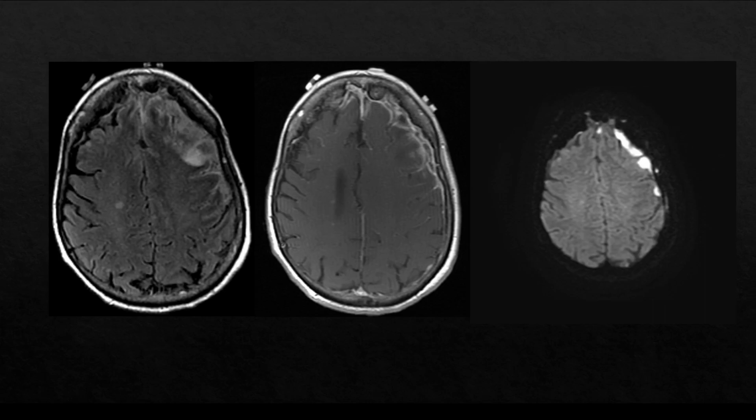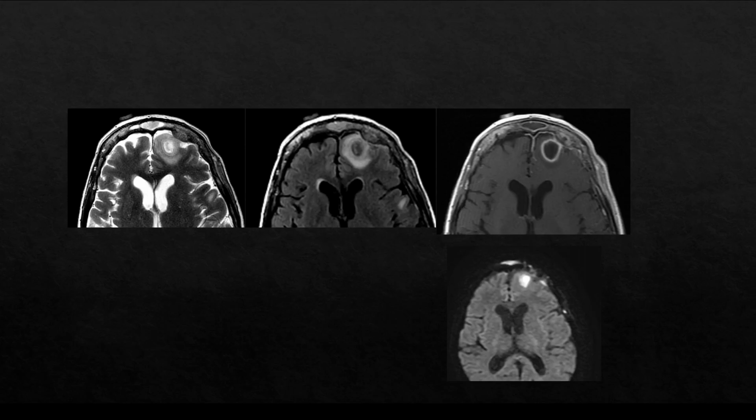Again, we see in a different patient this subdural empyema, abnormal enhancing material extending along the falx and in a crescentic shape along the anterior cranial fossa. Associated in that, the material restricts diffusion. Associated with this, again, we have abnormal parenchymal edema and mass effect. This would be a subdural empyema and cerebritis. This case is more advanced.